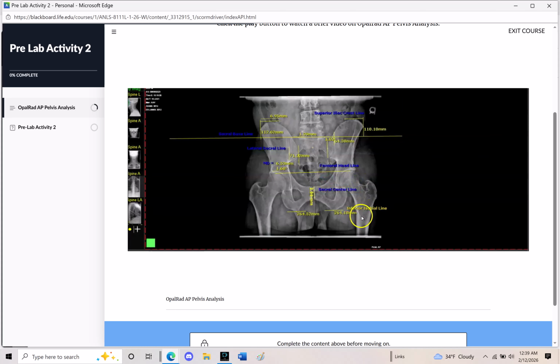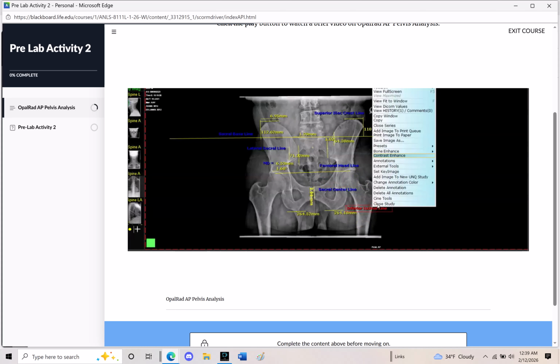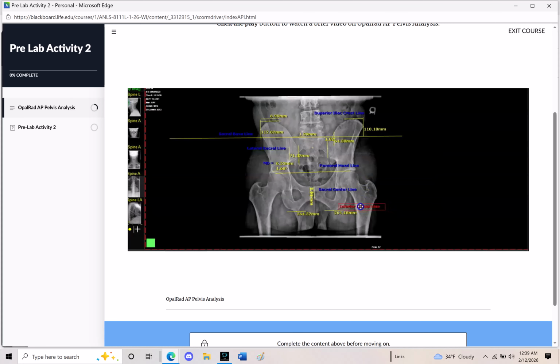So let's change that color. I want you to definitely keep these lines the way they are. The colors, I mean, of these labels the way they are. Just change it so we can get a little bit better contrast in some of those cases. So, show you what I mean by that. Pull that off. You can see them stand out a little bit better. You can always alter them and change a little bit more. So we got 1, 2, 3, 4, 5, 6. Good. All of our lines are labeled and 7 MD measurement. That should be it. We got it right on.